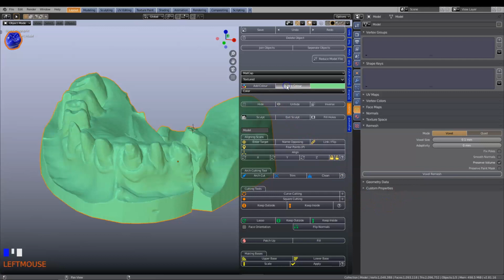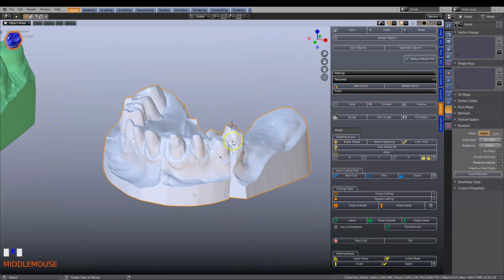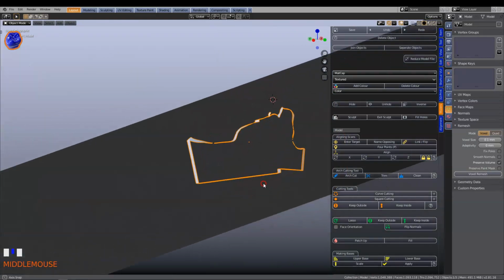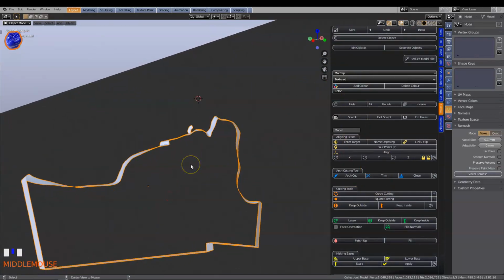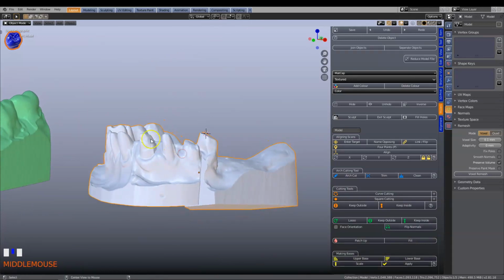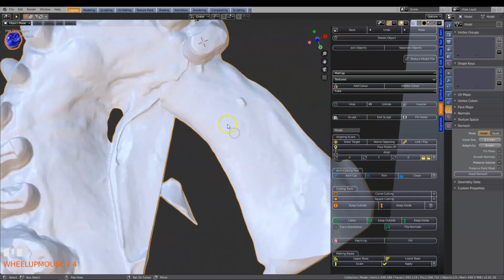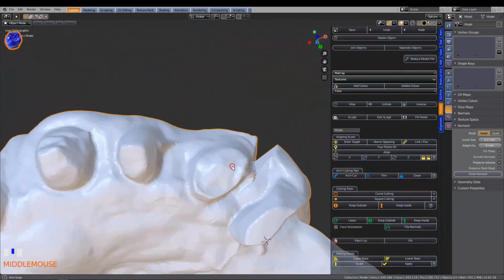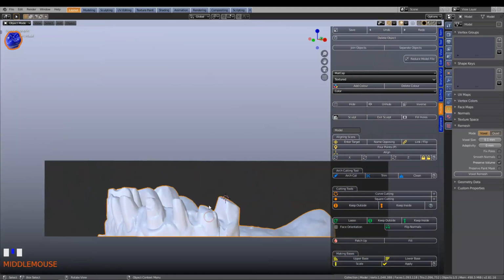and we'll just delete the color. Now if you have a close look into the cross section of it, Alt B, you'll notice we have one solid model. Let's do Alt B again to view the model from the inside. And now we've got two models stitched into one.